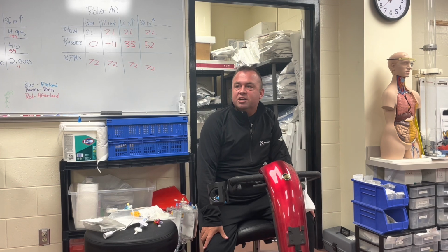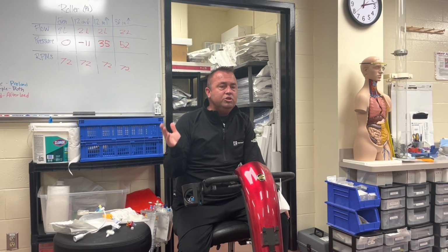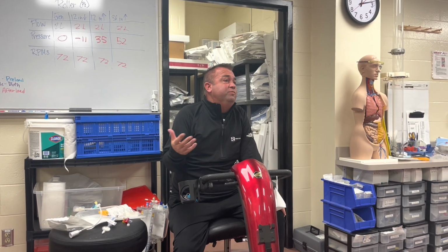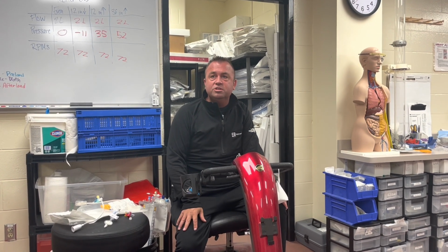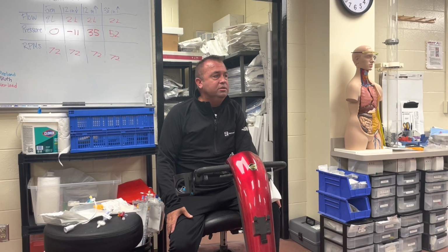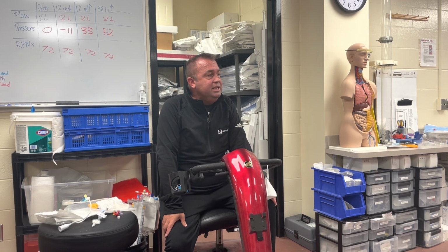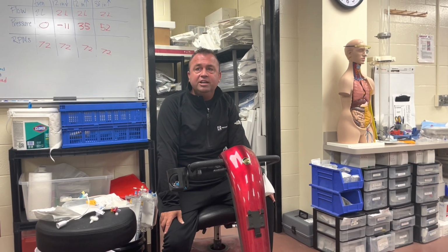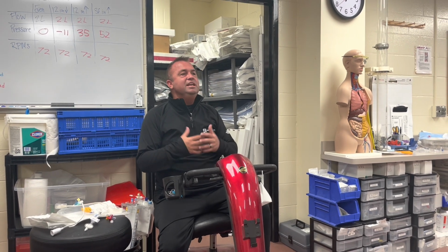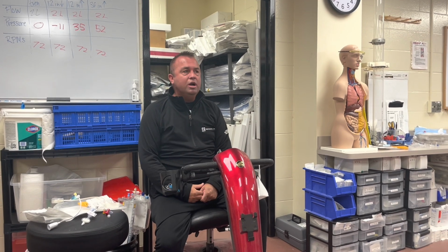Any questions about how a transducer system works and how we get it ready and how we set that up? Again, you can measure as many as 3, even 4 if you bring in another transducer, but they make single, double, and triple transducers depending on how many pressures we want to measure. The heart and lung machine is set up for 3 different pressures. We need to have that pressure bag at all times above that 300 in that green. Once it gets less and less, it will dampen our line. You won't see it as well because it's not enough to overcome the pressure in the patient.